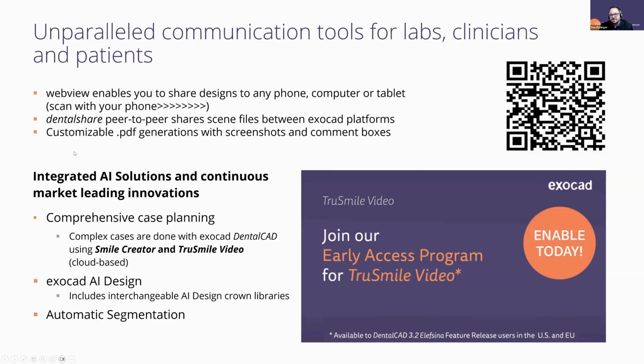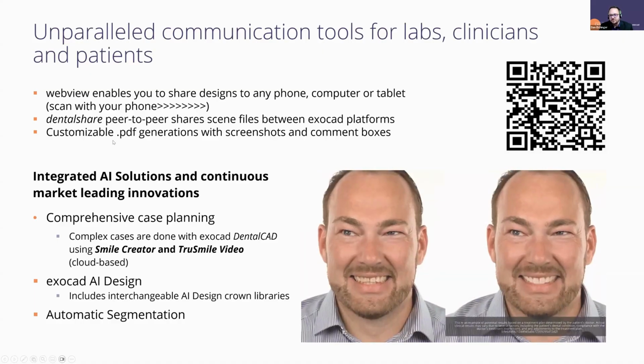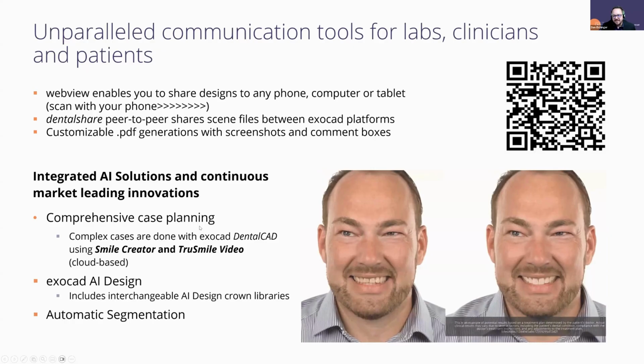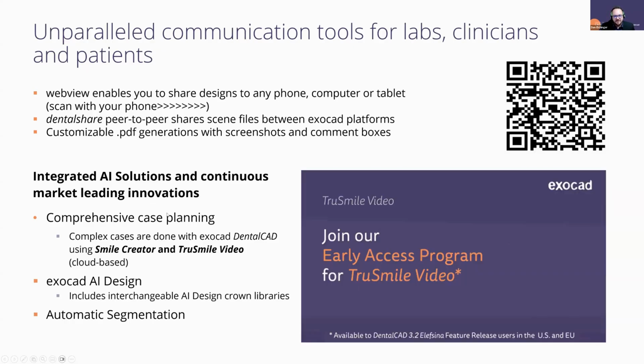It's really showing you what your new smile is going to look like. So very powerful sales tool when it comes to your customers. It's no more room for imagination. It's right there in front of you. And then once you get that approval from the customer, your design's ready to roll and you can proceed forward.